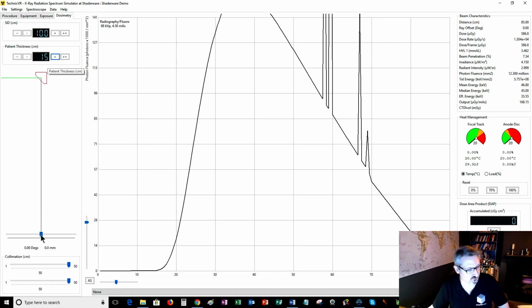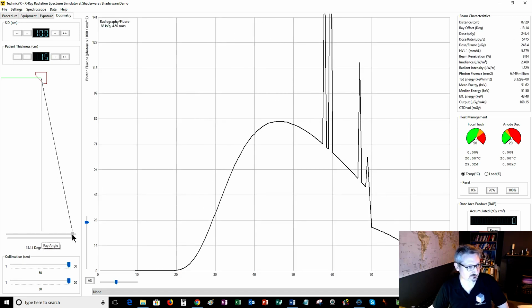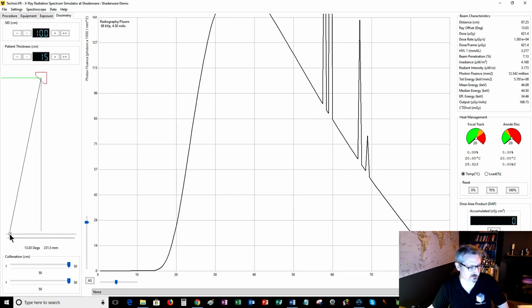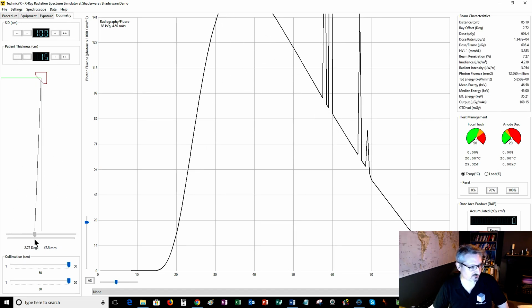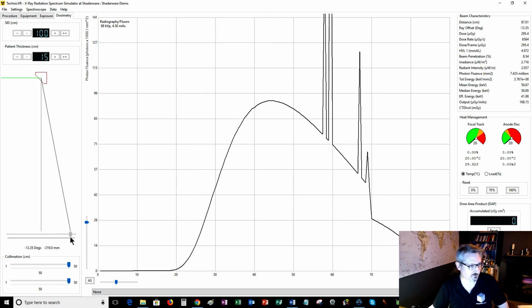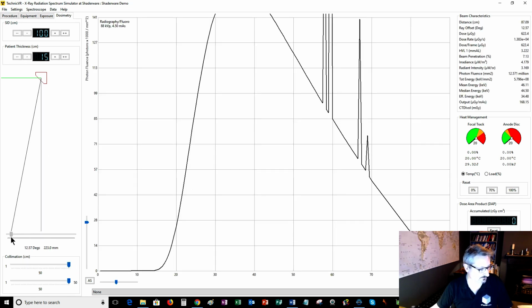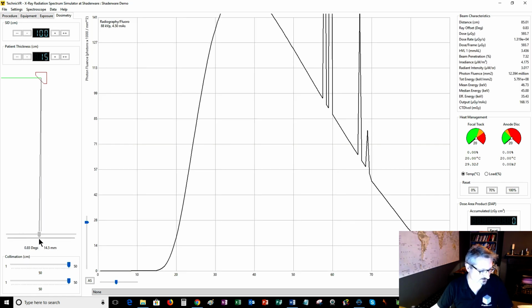And then what I can do is I can drag the detector towards the foot perhaps, and towards the head perhaps, and show the anode heel effect here. So we can show that when the detector is at the heel of the anode, towards the positive terminal, then we get less radiation than when it's towards the negative terminal. So we can actually mimic that as well. Okay.